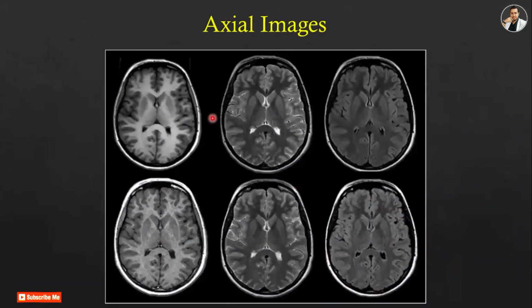There is another image. T1, T2, FLAIR. This is T1, T2, and FLAIR.